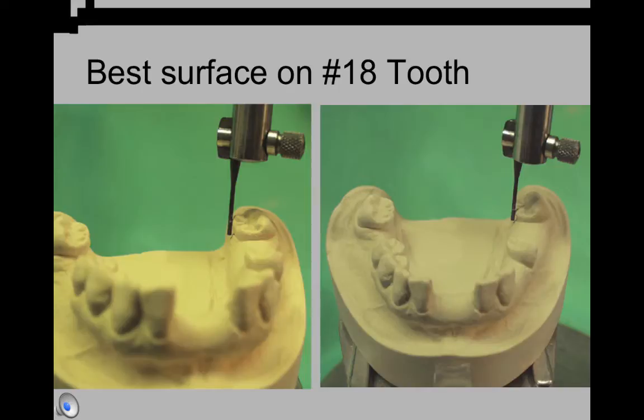You can also use a ring clasp on this side, but it would just complicate things as there's more metal and more rests. More metal translates into a higher risk of the framework not fitting properly.